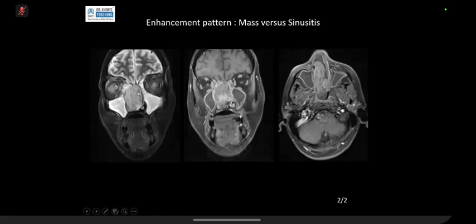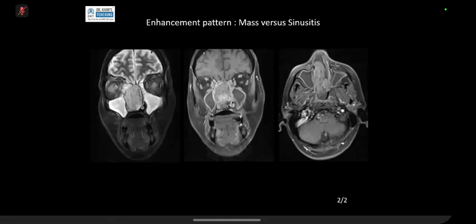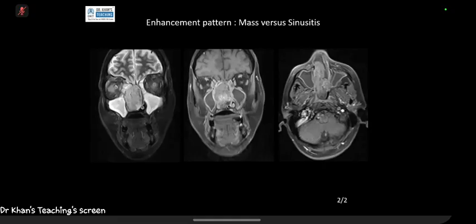This is actually the nasal nasopharynx. I thought it's a nasal cavity. Nasal cavity, yeah, okay. So the soft tissue in the nasal cavity, I'm not sure. It could be a lesion there.